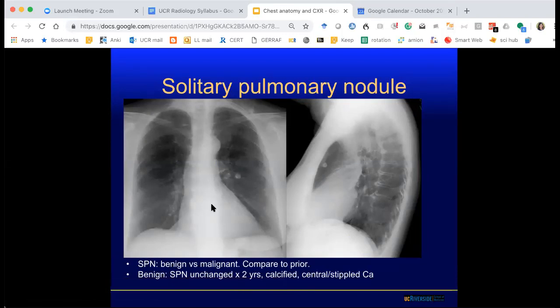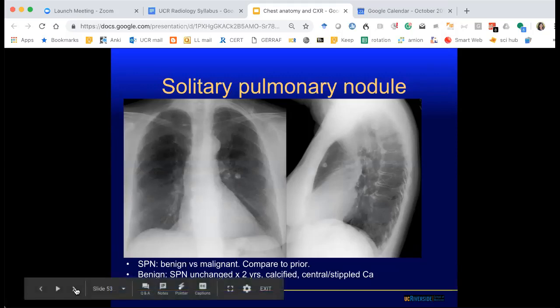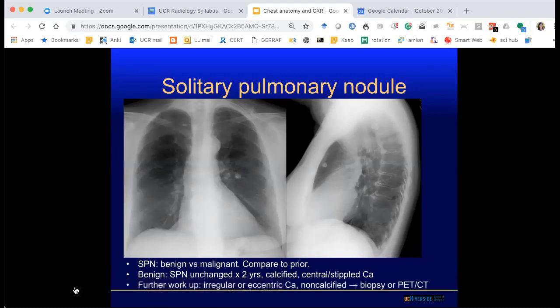It's not spiculated. Okay. A more important reason why it's benign. It's calcified. Calcifications, yeah. So this nodule is calcified, because you see this density here. Typically nodules that have this calcification pattern are usually granulomas from prior granulomatous disease, like fungal disease. So then they calcify over time. Okay.